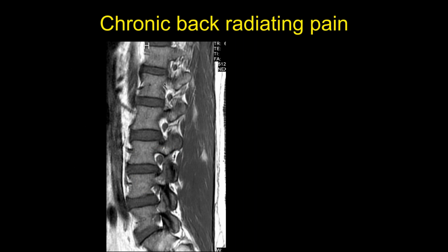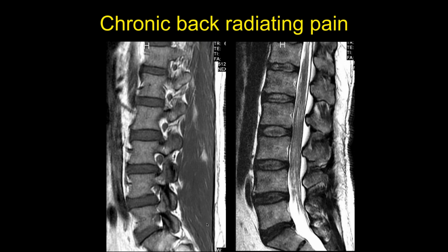Chronic back pain, radiating pain. Let's see, we have a sagittal. Looks like it's a T1. I'm wondering if that's just a plane a little bit off S1 from S2. What, down here? Yeah, right there, but that's at the edge. It's probably just the plane is very lateral to the neuroforamina.